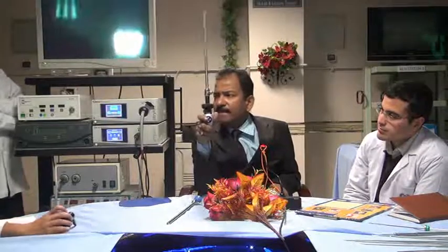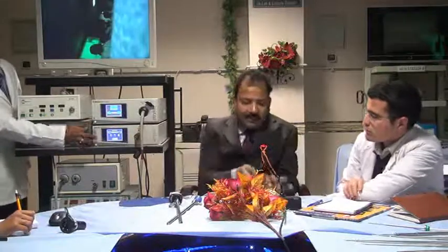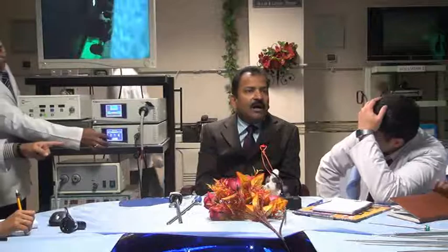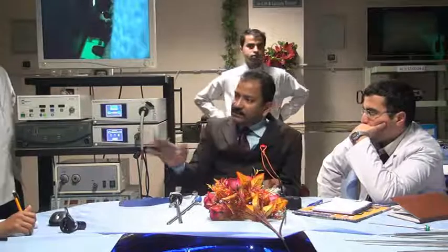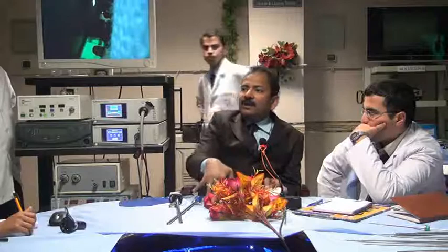What is the use of white balancing? White balancing is used to give you the exact color, and that color will not be influenced by your cleaning or light source or the blood or the betadine or the Cidex, isn't it? So if you have put your telescope at the wrong place or cleaned it with the wrong chemical, or it was an old telescope or a halogen light source, then also it will remove all the color impurities by adding the counter color so that your color will be correct.